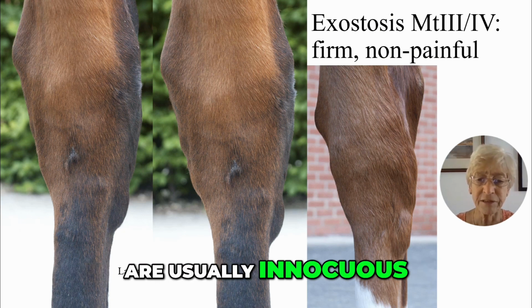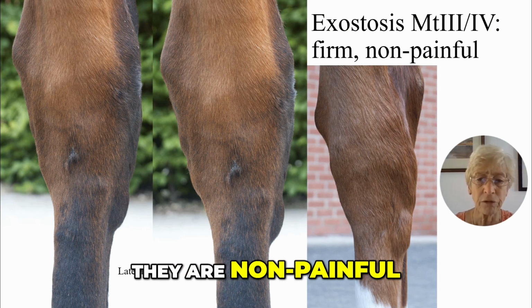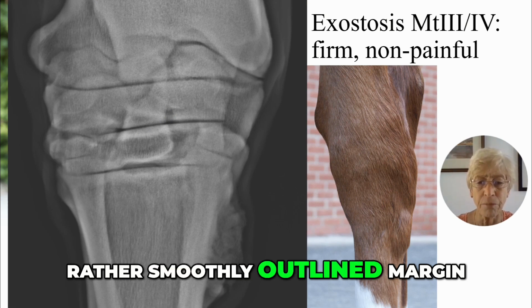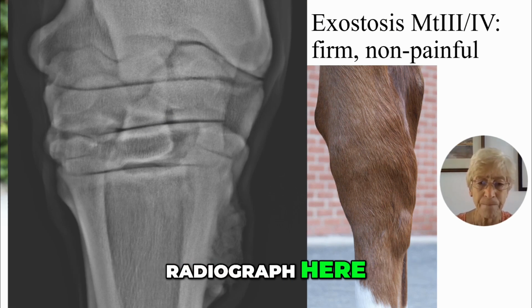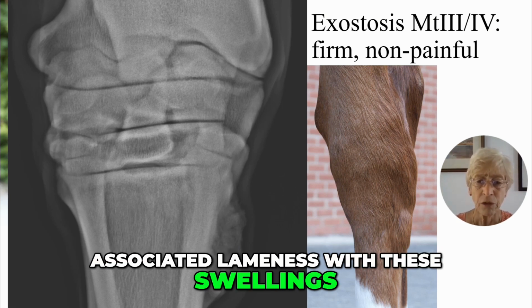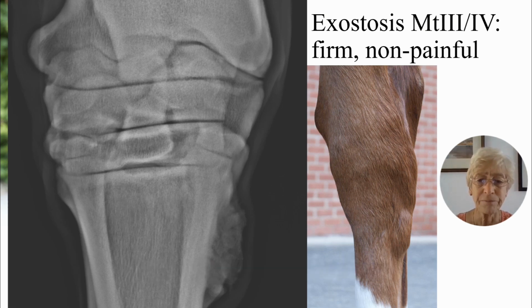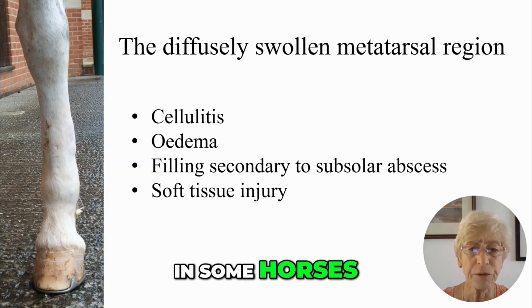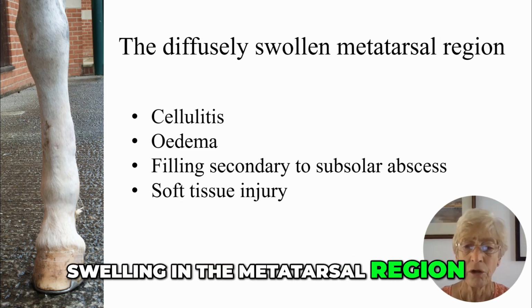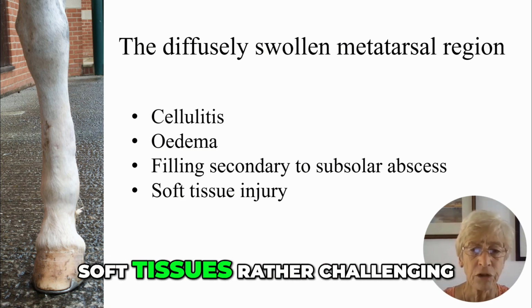These large osseous masses on the proximolateral aspect of the third metatarsal and fourth metatarsal bones are usually innocuous abnormalities. They are firm, they are non-painful, they often have a rather smoothly outlined margin as seen in the radiograph here. I have never known associated lameness with these swellings. We don't know why they occur. They may be unilateral or bilateral. In some horses, we will see diffuse swelling in the metatarsal region, which can make palpation of the individual soft tissues rather challenging.